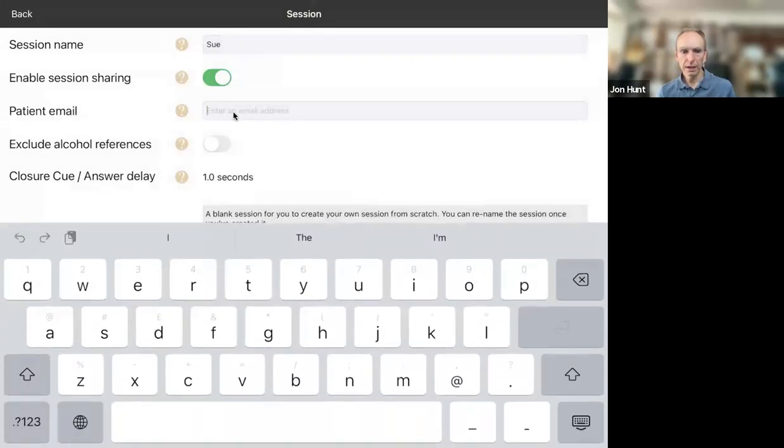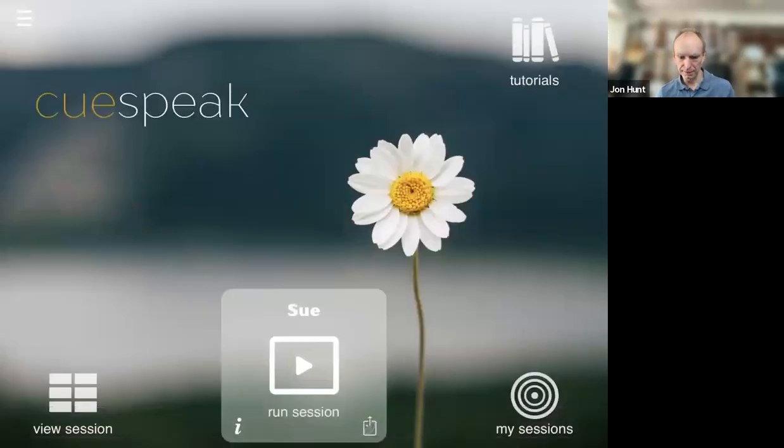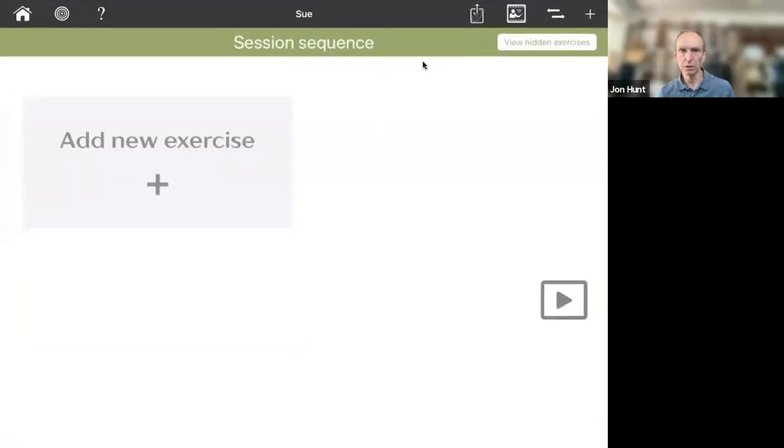And then once you've done that, when you press this button on the card, or actually this button's in various places, you can either press this button here, or the home user can press this tiny little button down here on the home screen, or from the exercise screen I think you can press this button, which is being hidden for me at the moment in the top around about here somewhere, but that's being hidden by my toolbar.